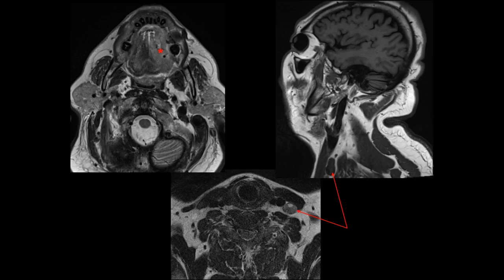As you can see in this example of a patient with a tongue carcinoma, all the levels in the neck are clear except for this low level 3 or level 4 node corresponding to a jugular-omohyoid node. And I emphasize this because you do not want to fall into the trap of saying, well, all of the levels proximal are clear, so this single solitary node inferiorly must be clear as well. So again, this is a potential pitfall to avoid.